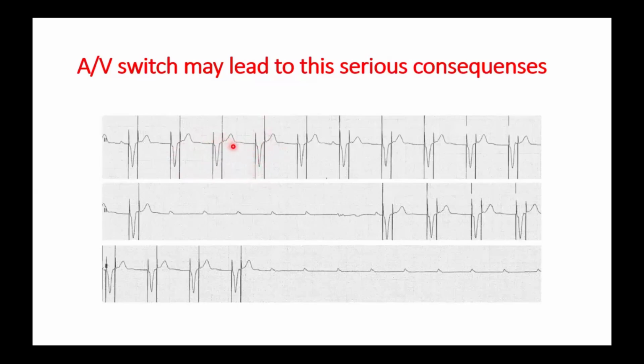as long as the pacing rate is higher than the sinus rate, the ventricle is captured. What happens here is that the patient has tachycardia. So actually the ventricular lead, the second one, senses that as V sensing, V sensing, V sensing, V sensing, V sensing, like VT. Is it clear or not?